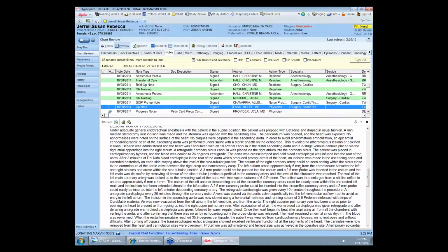I think what happens maybe is the IVUS catheter puts a guide wire bias on the artery and maybe even supports it or stents it open. Because it didn't look that tight on the ultrasound, but again, it's a Volcano system ultrasound, which is inferior quality to the rotating catheters.